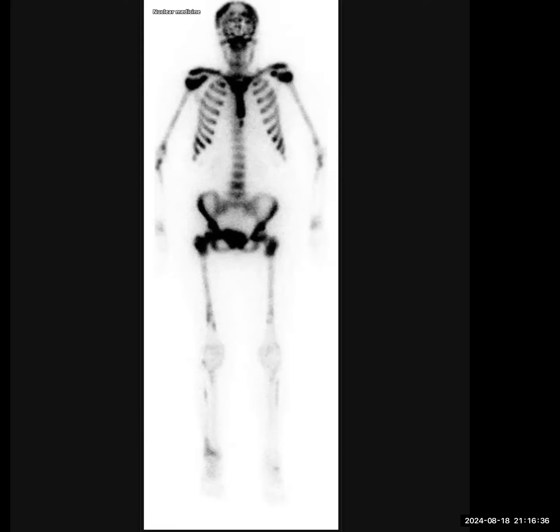Before we go there, apart from what you have already described, is there anything else that you see in these images? Okay, I'm trying to look for the primary if I could find any. Or, to be more accurate, is there anything you can't see in these images? I can't see any obvious lung lesion which could give this metastasis.